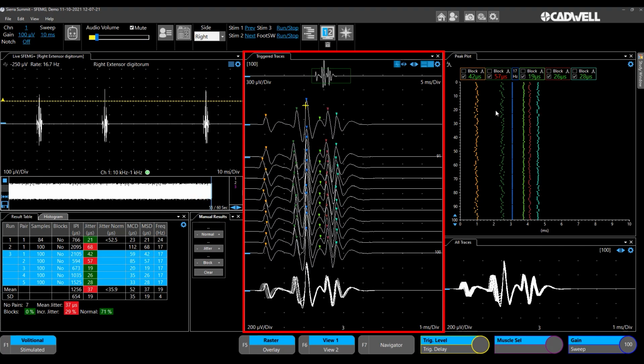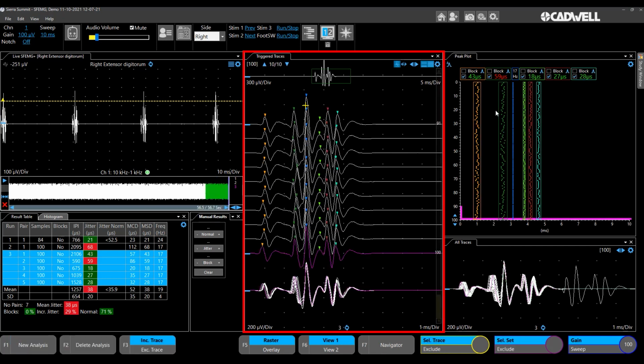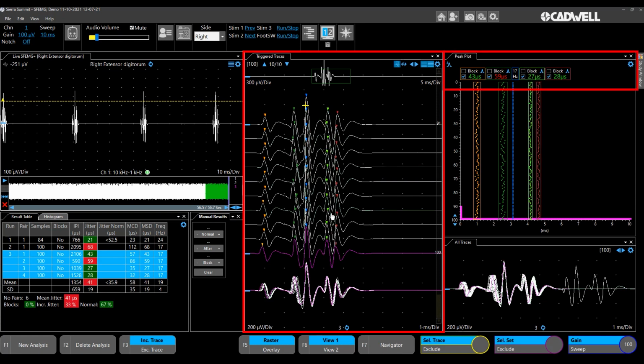Again, once the peak plot window is full, we can go ahead and hit stop, and then we can look at this data set here. In this case, if we wanted to exclude one of these peaks, like this green one, we may not want to use it because it's not quite as sharp as the rest of them. So if we wanted to exclude this peak, simply look for that color, which is a light green, and come over here and just uncheck this box here, and that'll remove that peak from the data set, and then reorder all the rest of the peaks.